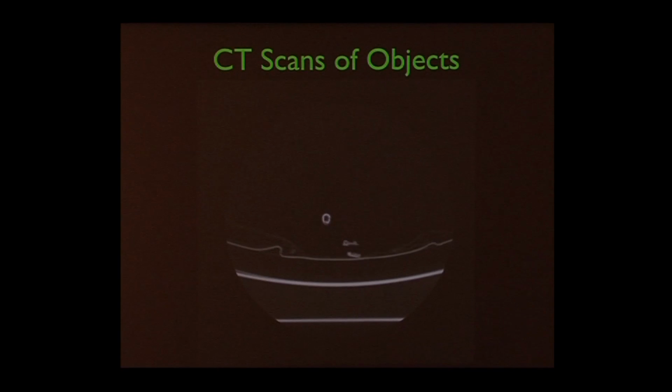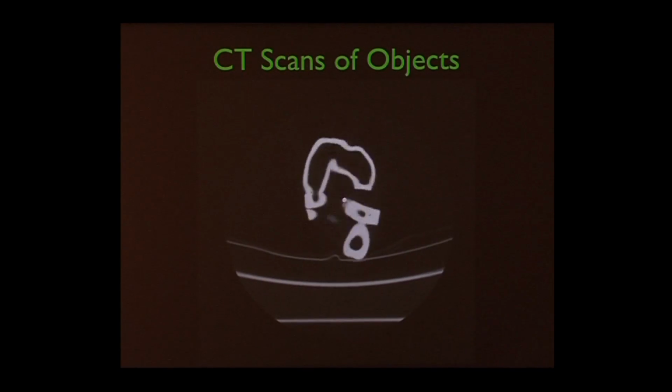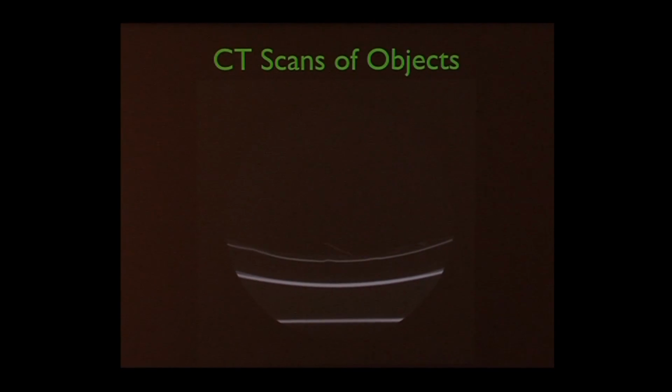Now, to give you a feeling for how powerful this is, I'm going to give you a little demonstration of something non-medical. On a Saturday on call here at UCSF, I had a break, and I took a bunch of things to the CT scanner and scanned them. They were things like toys for my kids' room, and I had a fossil I scanned, and things like that. These are different ones.